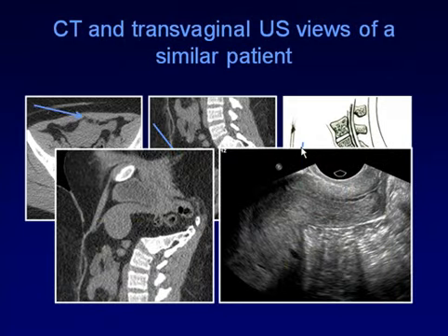So if I flip the CT image the way we look at ultrasound images, you can see that, and we put them side by side, on the transvaginal I have a wonderful view of the cervix, better than we usually see, but that unfortunately much of the uterus is poorly imaged because this is the part that's fallen back.